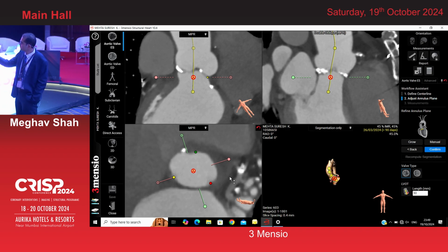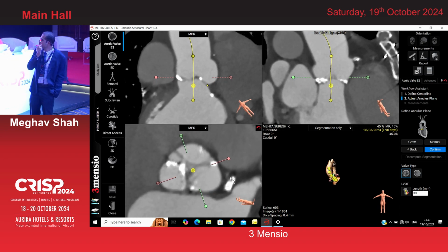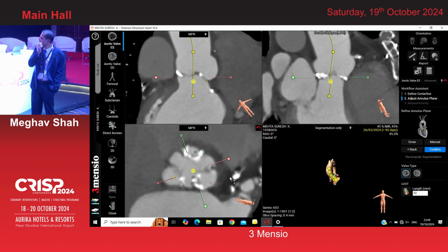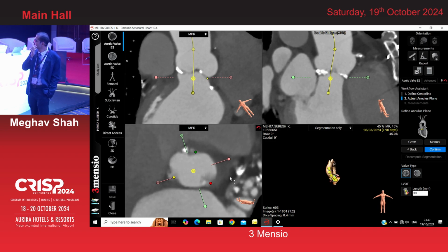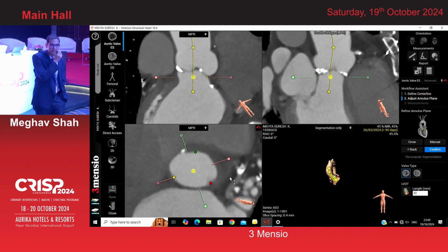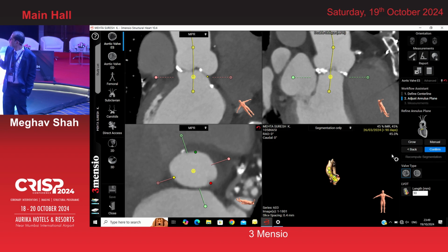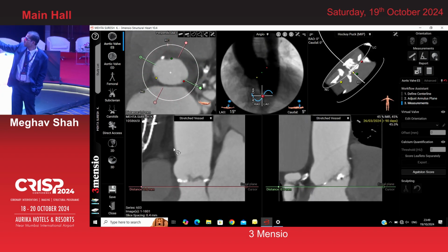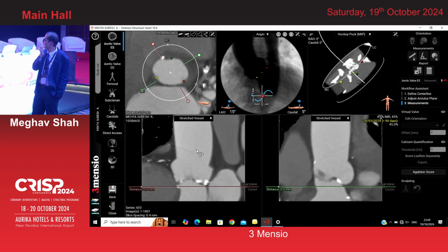Now, Gaurav, just run the entire frame. So we are going towards the aorta and now towards the LVOT. This is just a confirmation that in the single plane all the three cusps should go away. Yes. So this is our annular level. Now confirm the findings and then you go on to this page. He is rotating the annulus level, and these are the longitudinal stretched visual images that you are getting.